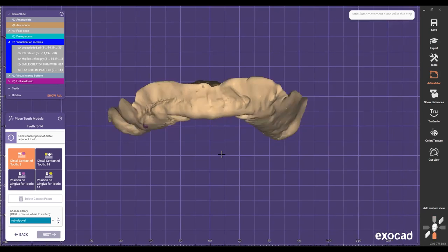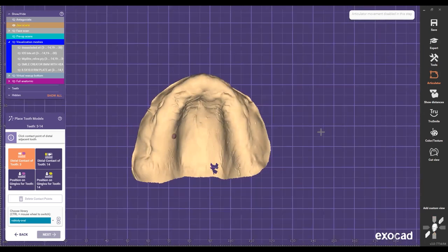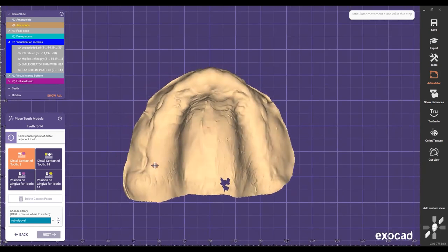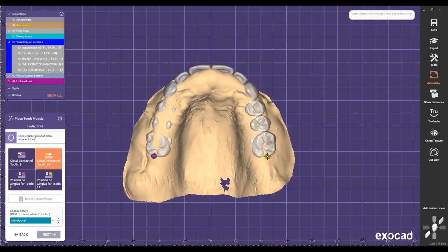But that's why we're doing this webinar, so you guys can see how Instaris is doing these cases. I hope this will help you to get these cases done properly. So now I'm gonna go ahead and select, I like to use the Rob Tully oval shape teeth. So in this case, I'm gonna go ahead and do this.